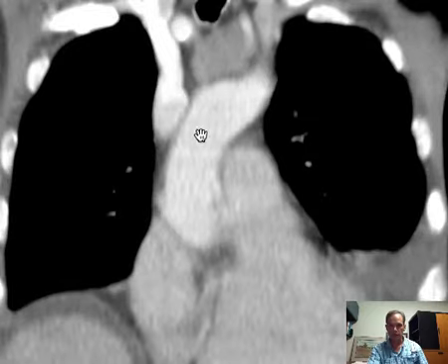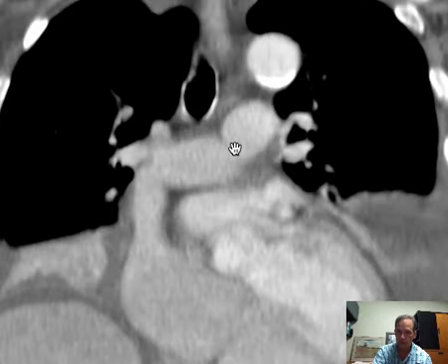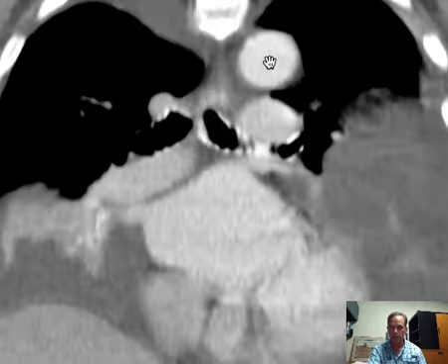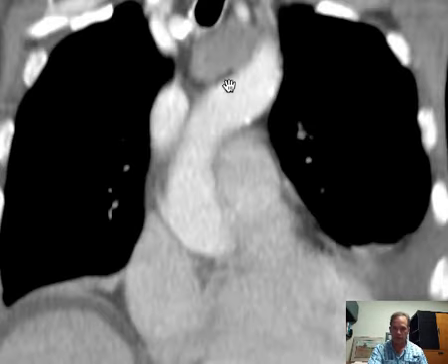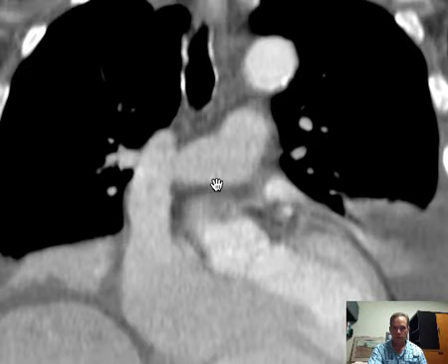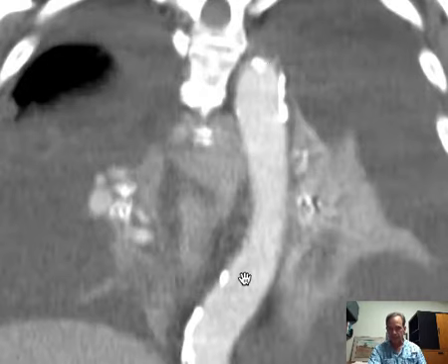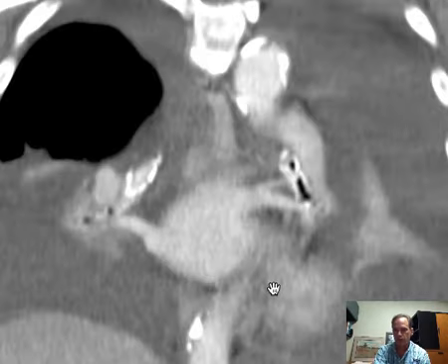Well, here's the aortic arch. It's arching up and then backwards and over. So if we look at this main pulmonary artery going under it, here you can see it goes off to the right and left. Where? Under the aortic arch. This is part of the aortic arch, as you can see. There it is, the aortic arch, and then you have the descending thoracic aorta, which then goes posteriorly and descends, which is a little tortuous, which happens with age, and particularly in patients that are hypertensive.